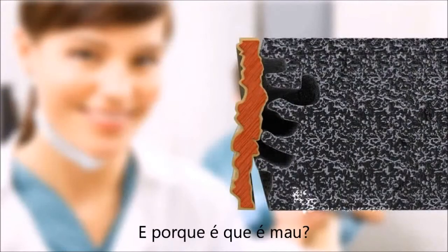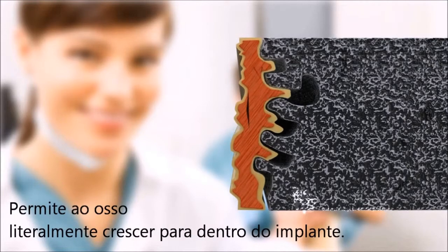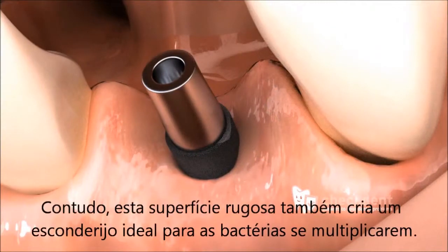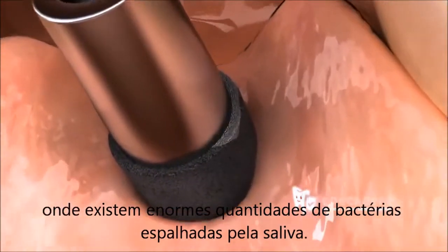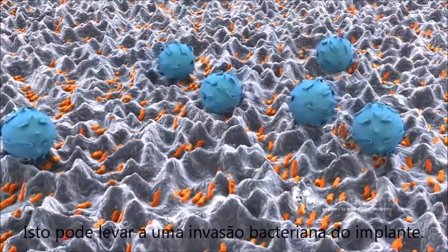Why is this bad? The implant surface is usually rough, and this assists in optimal bone healing. It enables the bone to literally grow into the implant. However, this same rough surface also provides an ideal bacterial hideout and nesting area. As soon as the implant is no longer within the bone, the rough surface of the implant gets into contact with the oral cavity. In the oral cavity, there are large quantities of bacteria in the saliva, and this can lead to a bacterial invasion of the implant.